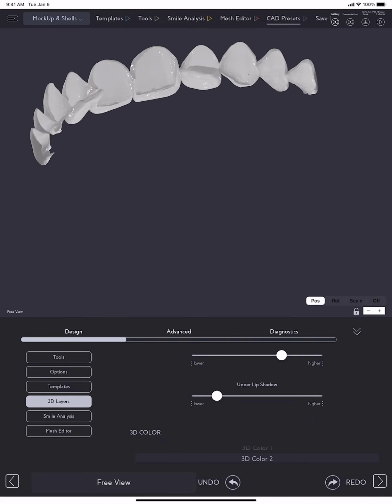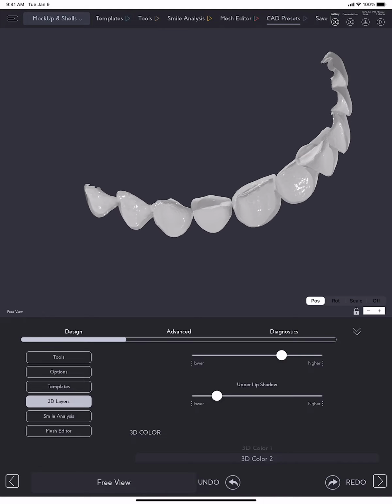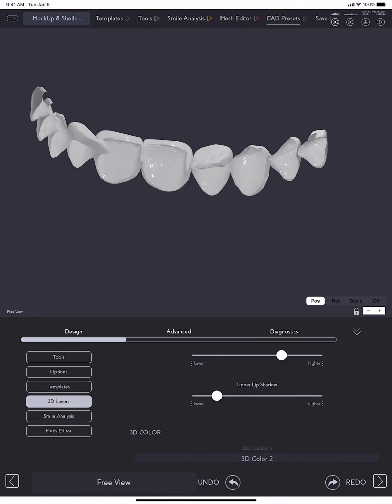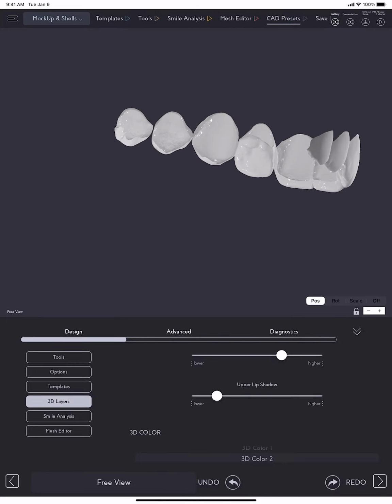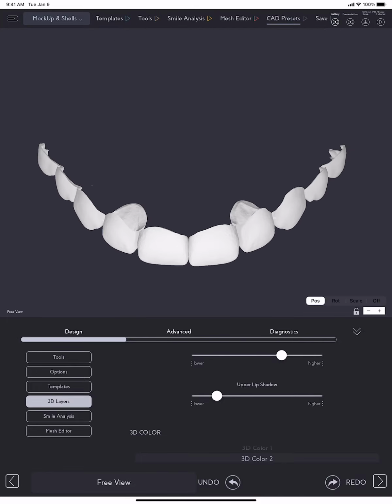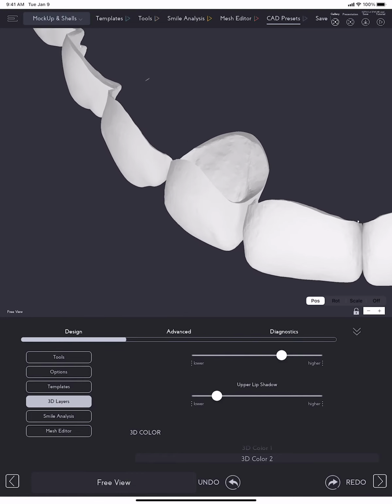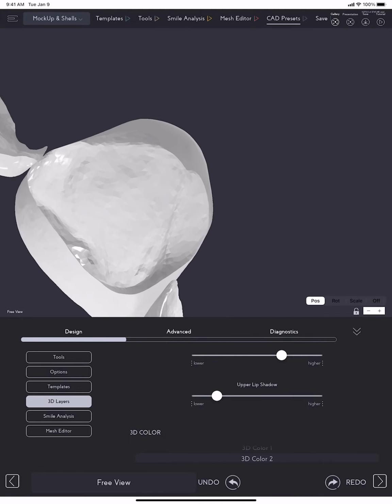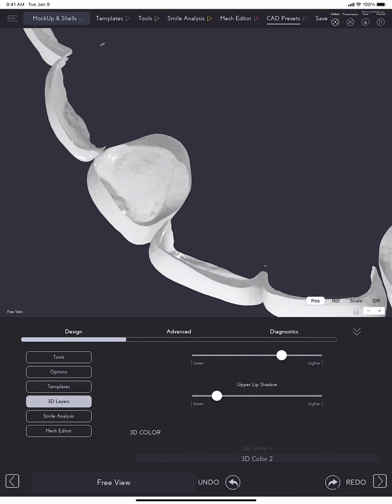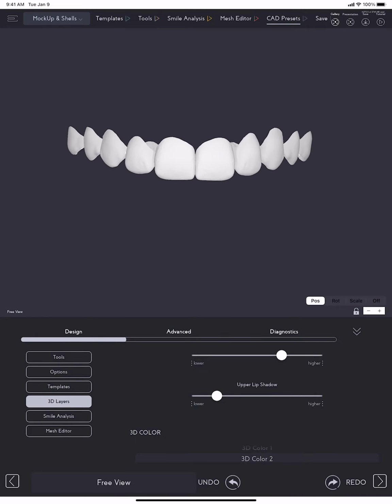We created for the laterals, you know, the laterals are like crowns, so that we can fix our shell mockup, right? So look, like this. It's like a crown. So now we can fix our shell mockup, and here we go. That's our workflow.